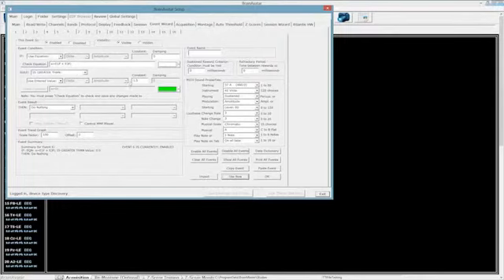Now, why am I doing 1.5? You can do 1.1, 1.2, 1.3, 1.9. You want it to not be 1. The reason I'm doing this right here is so that both events need to be true. You don't get rewarded when only one of them is true. You have to have both being met. So that's the reason that this right here is occurring.